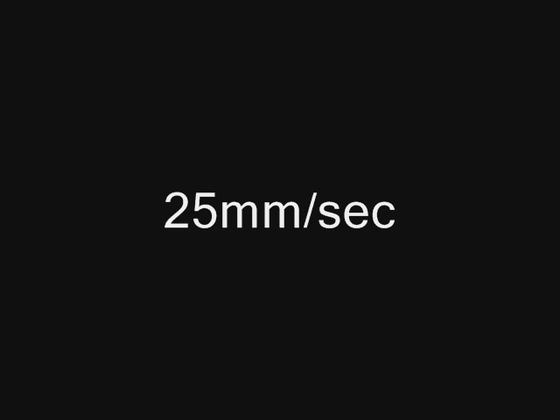Before we progress any further, it's important that I take you through the calibration on the 12-lead ECG or EKG. Internationally, paper comes out of the machine or the complex is passed by on a monitor at a set speed of 25 mm per second. You've probably realised that the graph paper represents time on the tracing, and depolarization takes time to pass through the various areas of the heart. You need to analyse these timings, and you can't if the speed calibration is wrong.